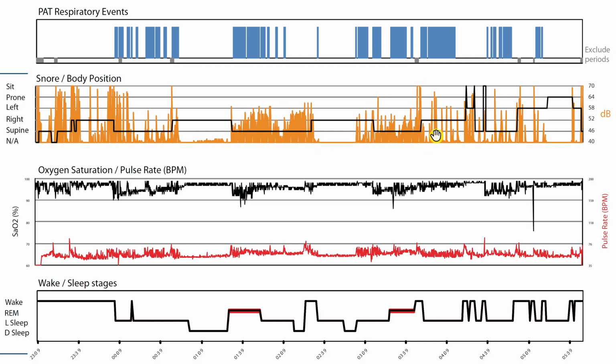Snoring sets on, right? I'm going to have to do a second video about this because there's lots of context that I can go into as well, but I'm just not going to do that in this video. This is just basic how to read this, what it says, so you can look at it yourself and have your own independent thoughts about it. And then I will do another video where I actually talk about what certain things mean when you line up the data.